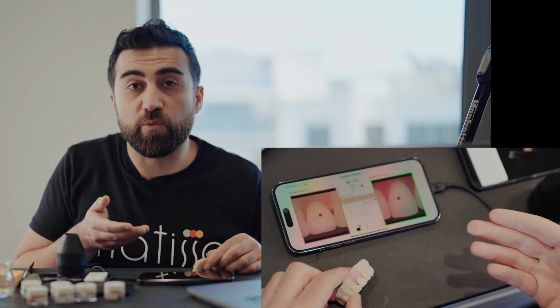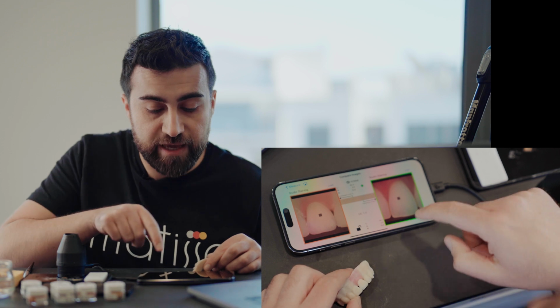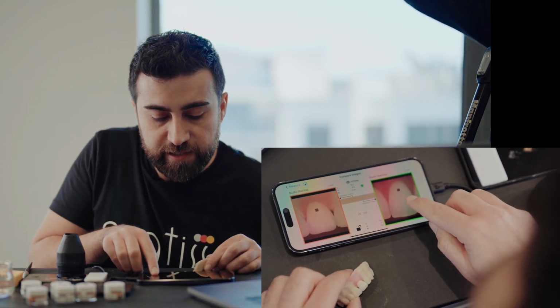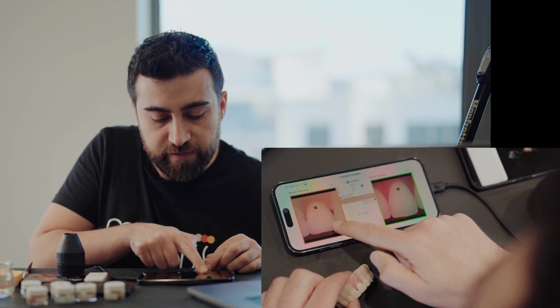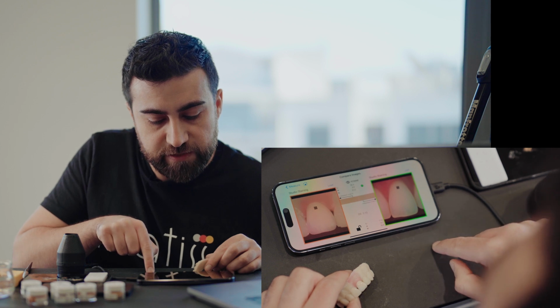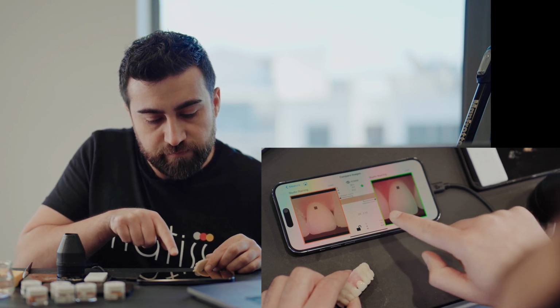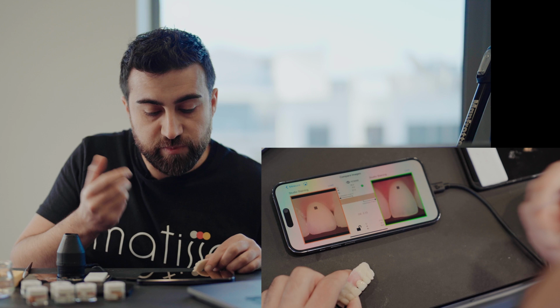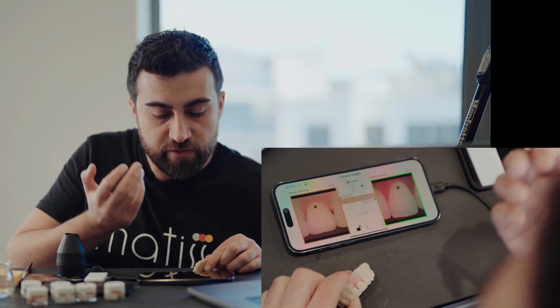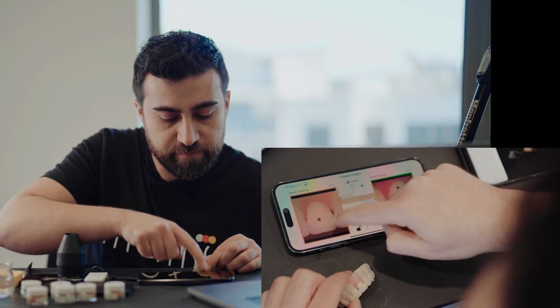So we are now Delta 1.11. So it becomes even closer. Delta 1.88, 1.5. Cervically it's 2, because the red is a little bit less, but that's fine. When the crown goes in the mouth, the red will increase a little bit more because of the gum.